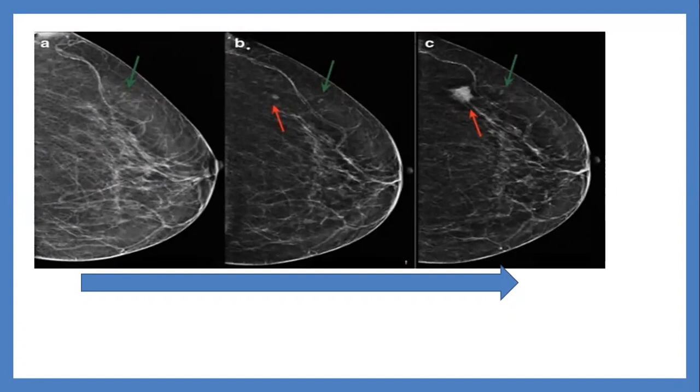While just posterior to it, in the middle mammogram, there is a small developing asymmetry that's shown to be an irregular dense spiculated mass on the latest mammography. So it will be BI-RADS 5, a spiculated BI-RADS 5 mass, because of the spiculated mass.